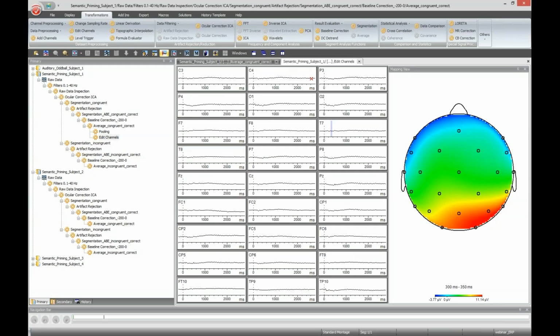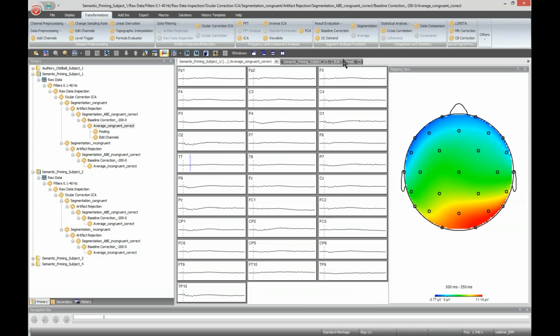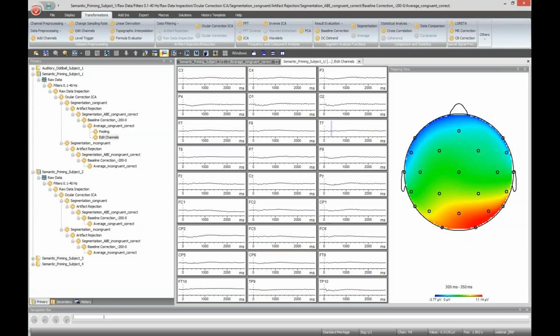It looks very similar, but you can see there is something happening here in the front. Okay, I think it fulfills what I want to explain. If you take out channels, you don't see them here anymore. The topography is, of course, interpolated from the other channels, because you have only voltage values at each channel.